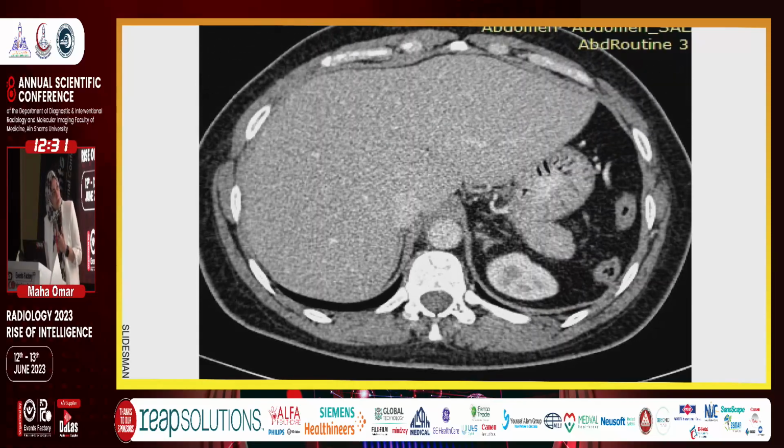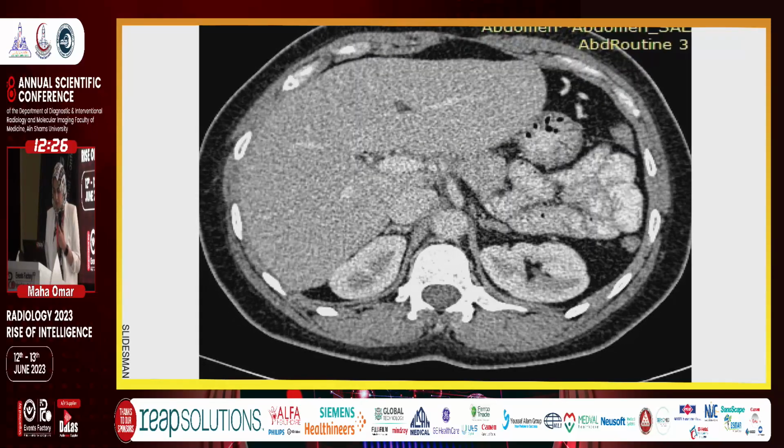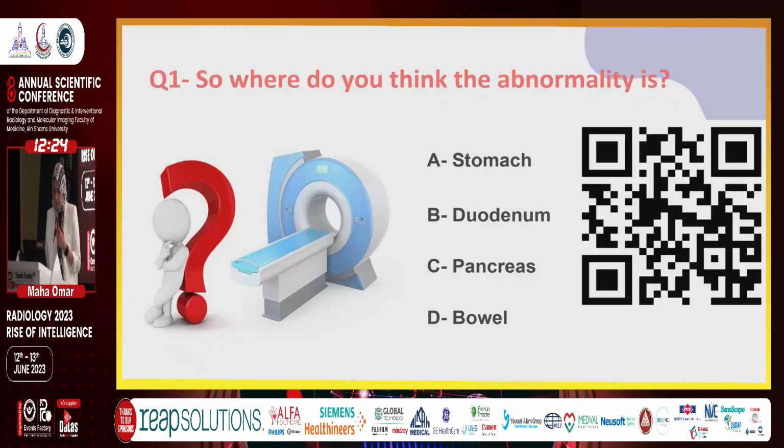It's the same. Okay, for the sake of time, the delayed phase is withheld. It's not important for the diagnosis, okay?